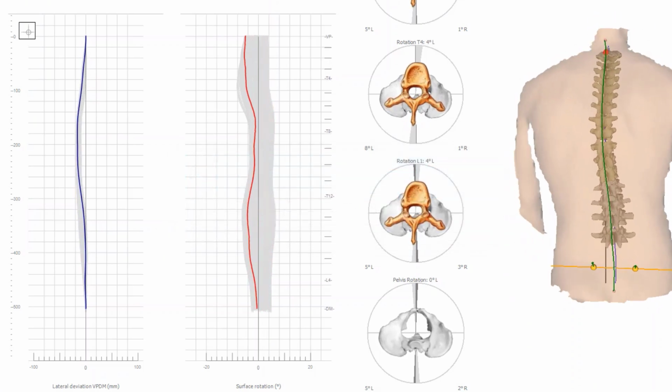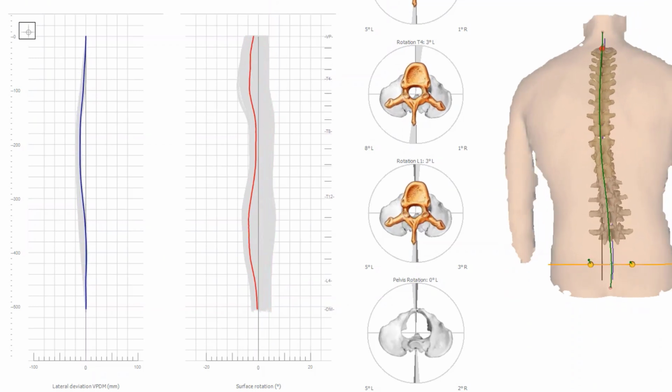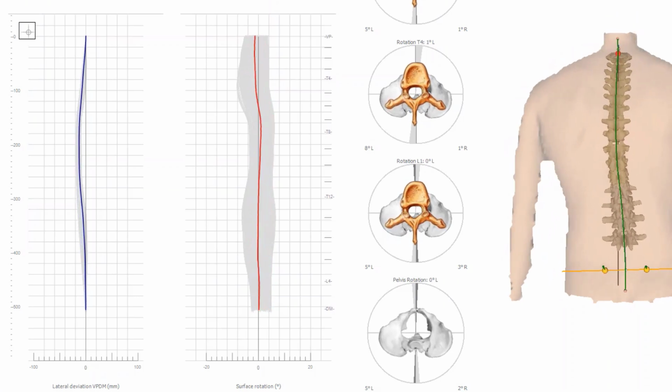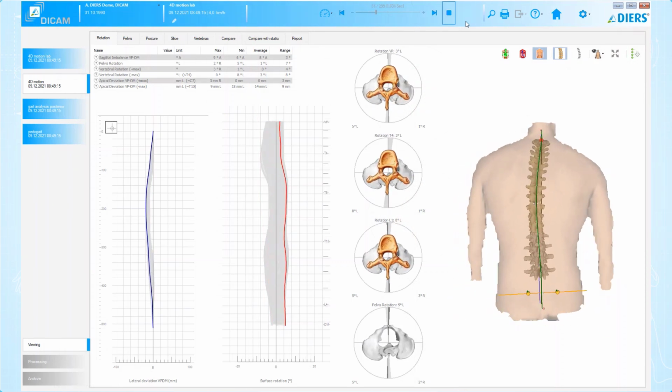In the context of clinical gait analysis, the movement sequence sometimes recedes somewhat into the background. In order to alleviate the complexity of the movement sequence somewhat, it is sometimes advisable to first concentrate on individual images at certain points in time in the gait.